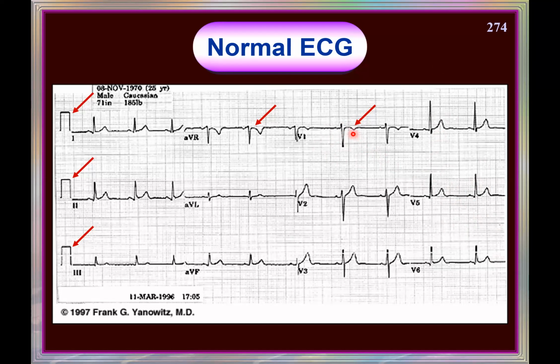And the T wave is usually inverted in V1. The P wave is very well seen, and this is one area where the P wave needs to be studied. P wave study in V1 and lead 2 are the two leads where we study the P wave. T waves are inverted. So these are important things, and the ST segment should be at baseline. That is the flat line.